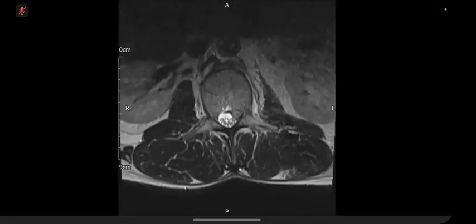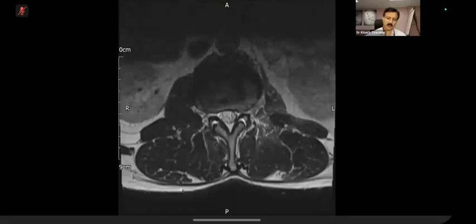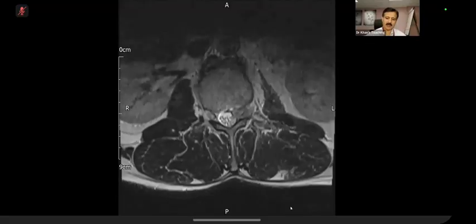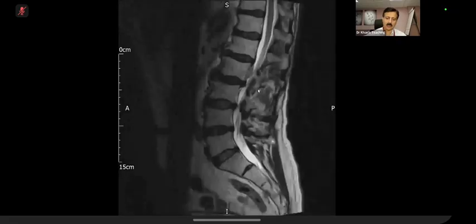So what is your conclusion now? That there is a bony exostosis at that level that represents it. It looked quite separate, or it could be a sequestrated disc, I suppose. Sequestrated disc. Okay, fine. This is a sequestrated disc, and I will do the teaching now.